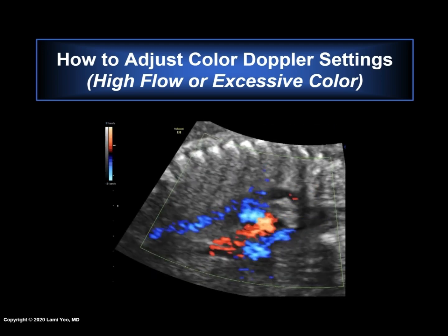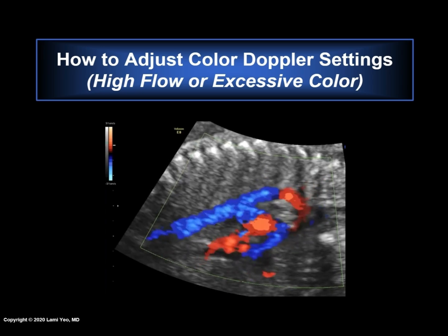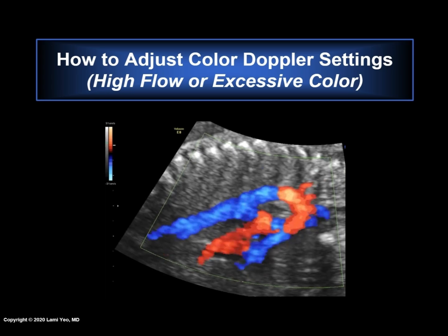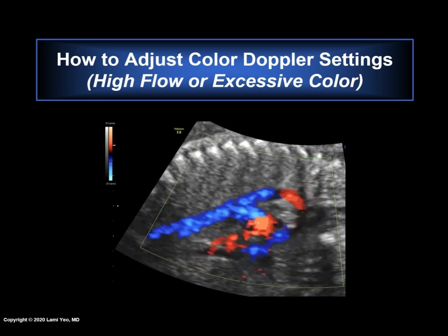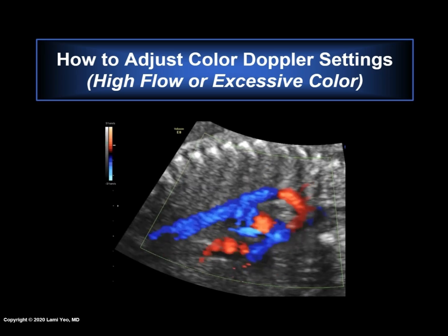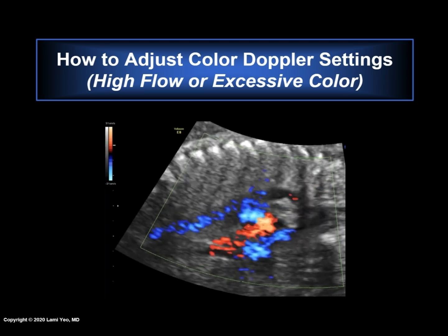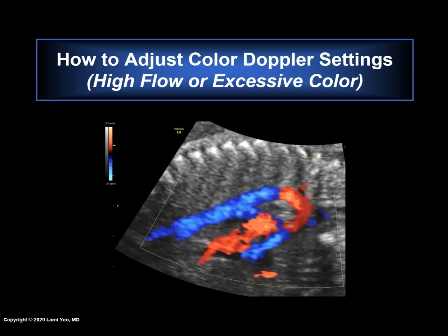The last example shows an aortic arch, but with excessive bidirectional power Doppler flow and a blooming artifact. Notice that the color bleeds beyond the vessel wall into adjacent areas. Remember that blooming can be especially pronounced with power Doppler because it is more sensitive than color Doppler to detect flow. In addition, the velocity scale is too low at 31 centimeters per second. Since blooming is gain dependent, to eliminate this artifact, lower the gain. The PRF should also be increased.